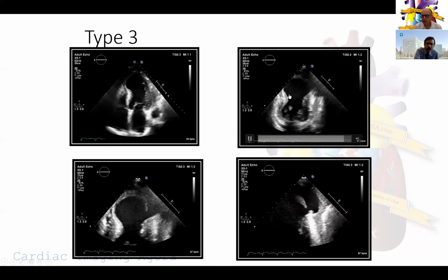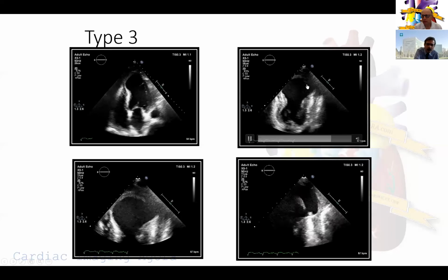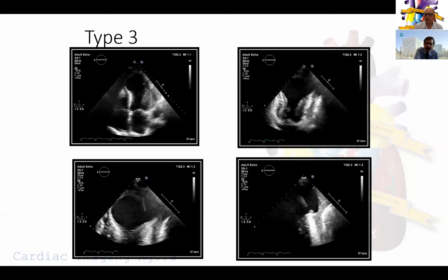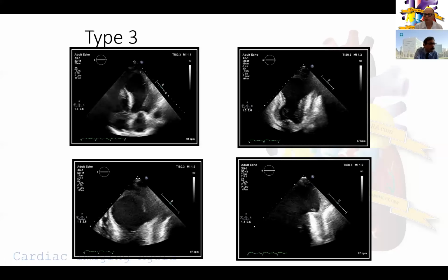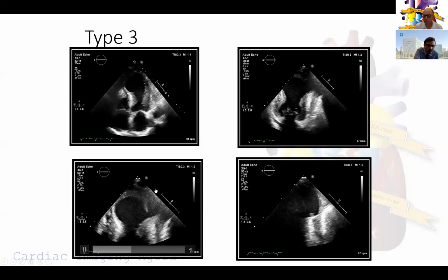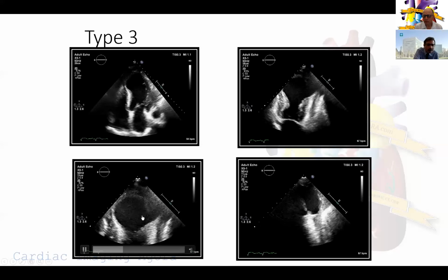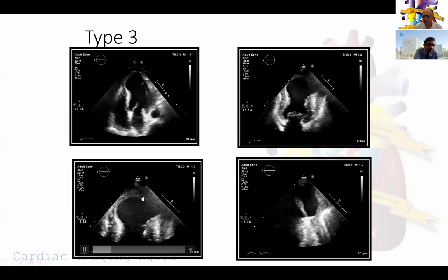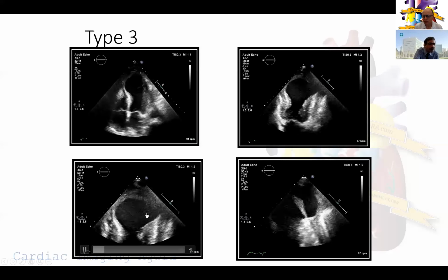As you look on the right, you see that the contour of the myocardium is not very clear. And in the anterolateral aspect, you wonder whether you can see the complete wall. And I would submit to you, in a busy situation, you may disregard this and still continue to believe this is just an uncomplicated LAD infarct. When you look a little closer in the bottom left, you can actually see a mobile density, and this density is continuous with the apical wall, and this does not represent a thrombus.